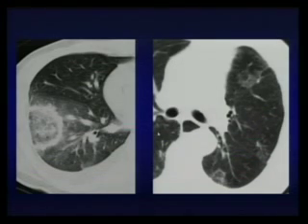Okay, wonderful. Well, here we have the ground glass opacity, and we can see the soft tissue surrounding the ground glass opacity. This is a case of paracoccidioidomycosis. But in the other case, we have the same finding with ground glass opacity, and this is an organizing pneumonia. I couldn't say cryptogenic because cryptogenic means no etiology.